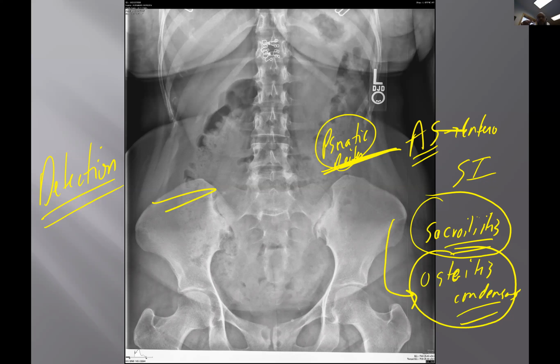And so when you have the triangular sclerosis, you guys, that's really in stage, the Wolff's Law, the body's thrown down sclerosis trying to stabilize that. Well, what if we got at this earlier before we threw that down and created degenerative changes? Well, then we would have our smoking gun. We would have our cavity, our subluxation. We'd have our finding that was researched and put on the map, and then we could deal with it.